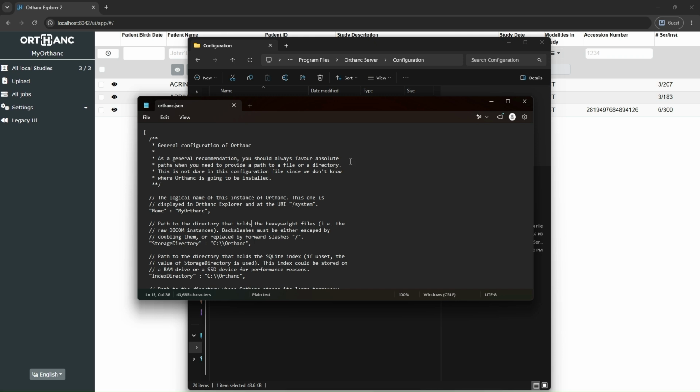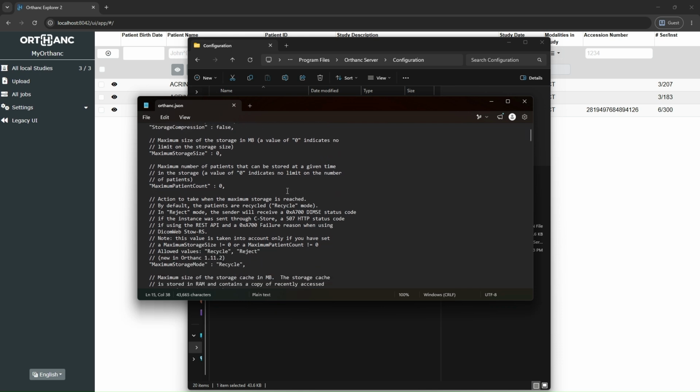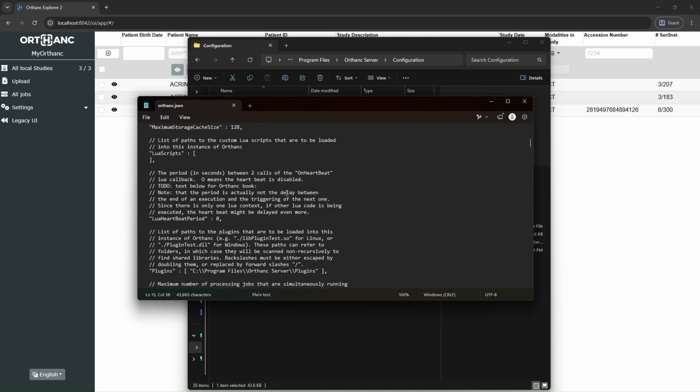Now, let's take a look at what we have out here. And what we have out here is, especially if you're looking at this for the first time, a bit of madness. You're looking at this going, oh my God, what is this? And yeah, it's quite a bit. And if you're a beginner, it definitely is a lot. The problem here is most of the stuff is not actually your config. The problem here is this orthanc.json file for this specific implementation actually doubles up as instructions for how to configure Orthanc. So quite a lot, and you do have to know the basics of JSON. We're going to solve this in the easiest way possible.